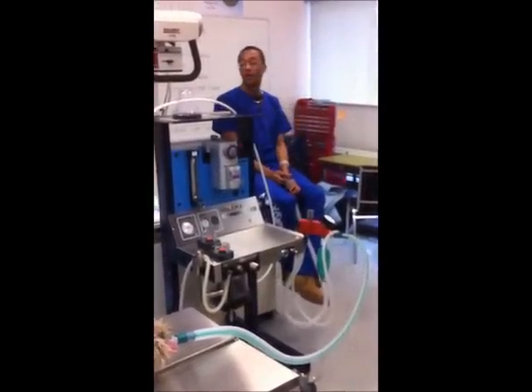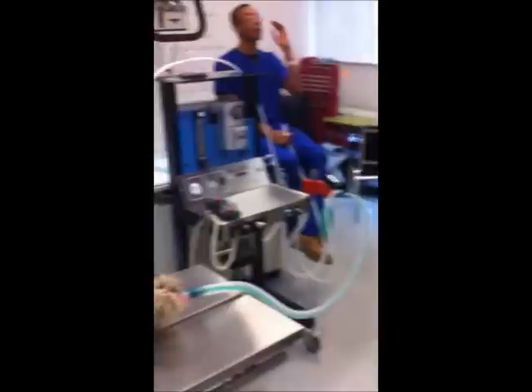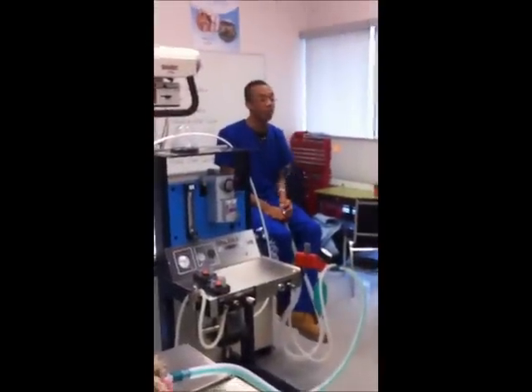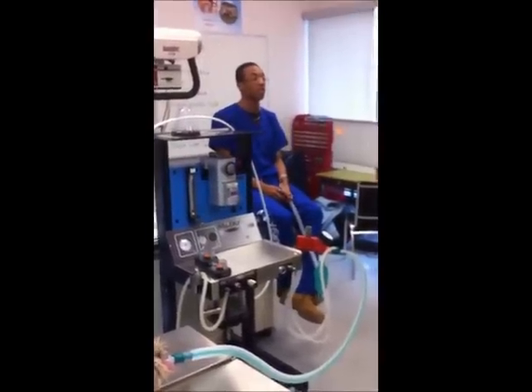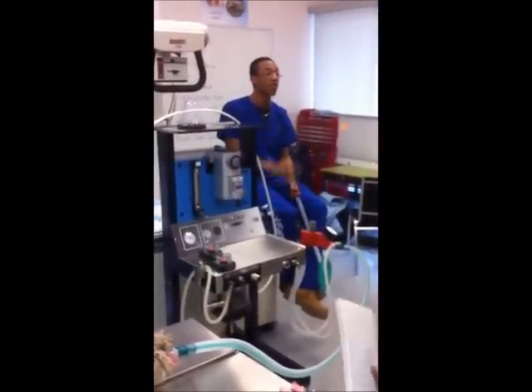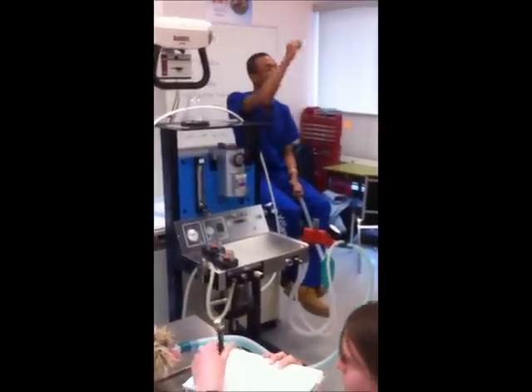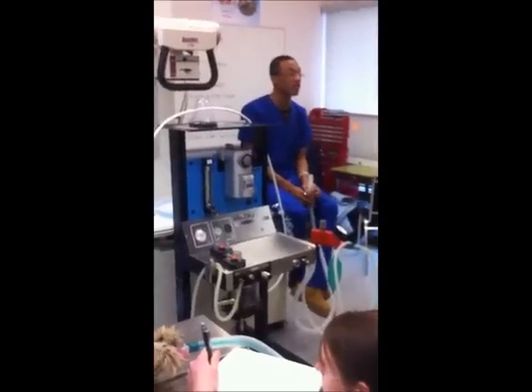Okay, we're going to run through bagging. You are in surgery and your patient is starting to arrest on the table. You are monitoring all the systems and you see this is happening. What is the first thing you do? Tell the vet. Good. After you tell the vet, what is the next thing you do?